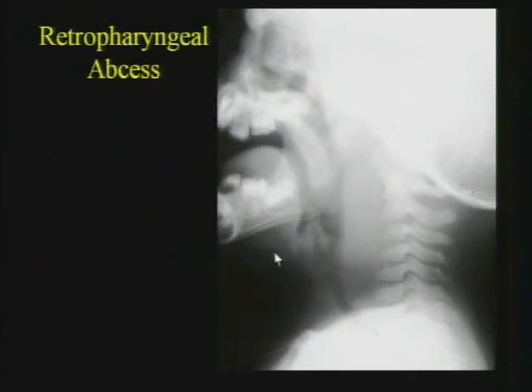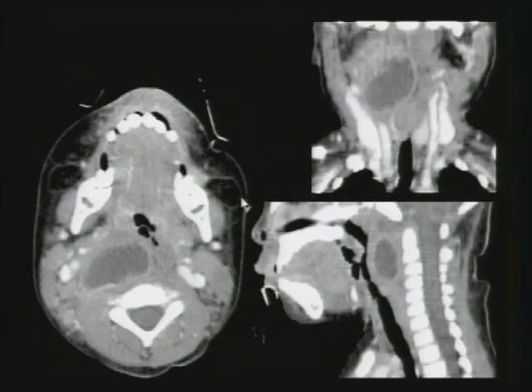And moving along, as we're coming down the nasopharynx, you can see that the soft tissue in the retropharyngeal or prevertebral space is too thick. And if you were sure that this was taken properly and in inspiration with as much extension as possible, you would suspect that there was an underlying lesion, in this case, retropharyngeal abscess. Most of the time now we do a CT scan to help the surgeons decide whether to drain it and where to drain the lesion. And here you can see a retropharyngeal abscess with rim enhancement seen on both the axial, coronal, and sagittal reformations.